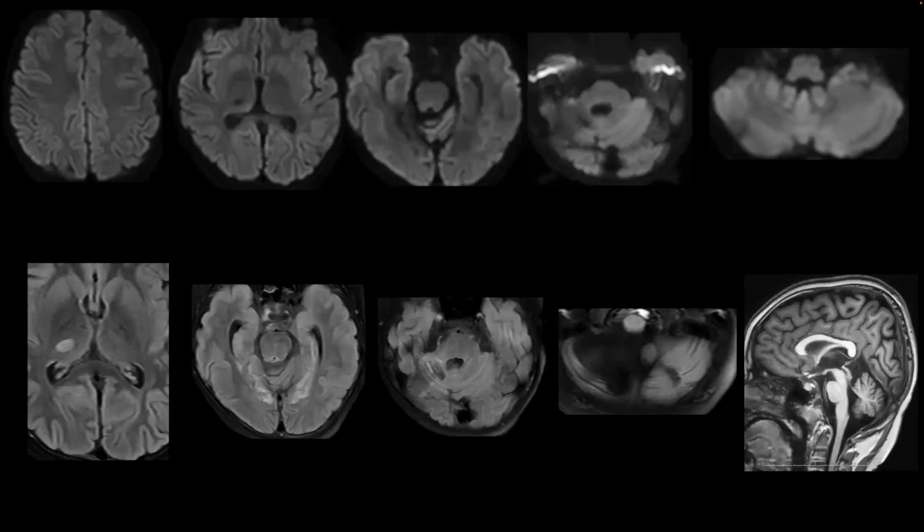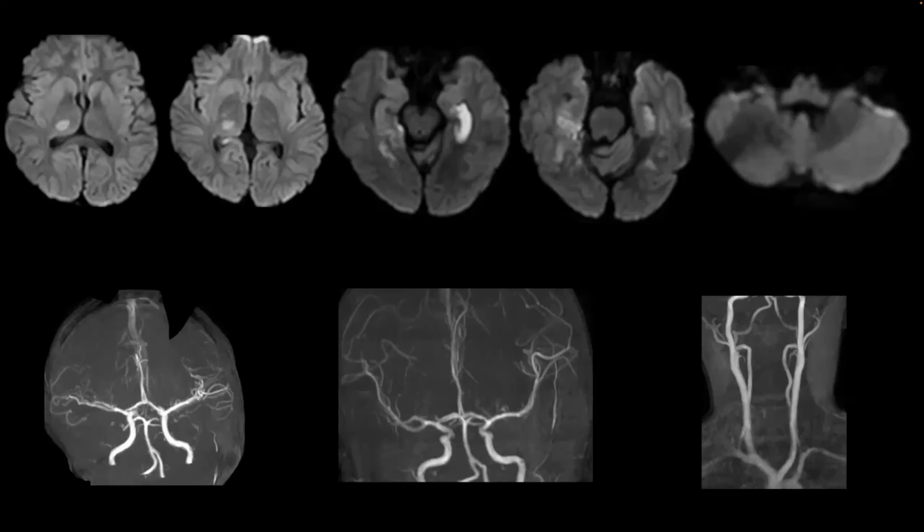But would that explain the recurrent nature, Dr. Kavita? So the question is why we are getting this recurrence. Vessel wall enhancement is patchy. It's sometimes coming in the V2 segment of the vertebral, sometimes in the PCA. So it is not causing any bleeding or any permanent stenosis, like a progressive arteriopathy. Or is it just recurrent thrombosis, and we are not able to find the cause also. So we are really not sure how to go about this child.